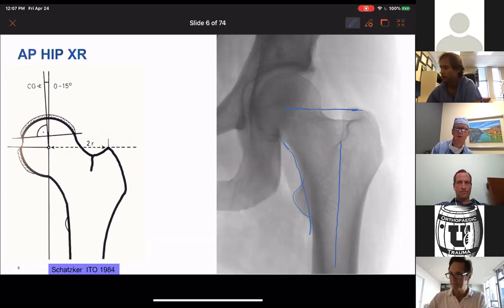Fifth, there is a particular shape at the superior aspect of the femoral neck coming out onto the shadow of the greater trochanter. And on a true AP view, that particular shape is typically maintained. Now I'm going to show you some examples of radiographic anatomy, just normal variations in anatomy or mild pathology that are going to affect that. But for the most part, when we're looking at an AP of the proximal femur, we're expecting to see a particular shape at that location. You might say, well, who cares, right? Why does that matter what the shape is there?